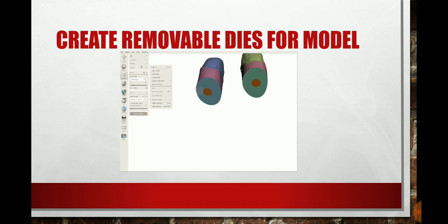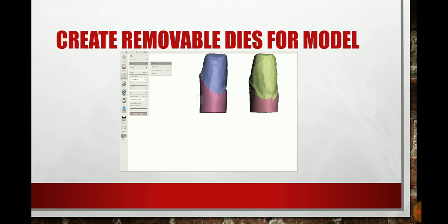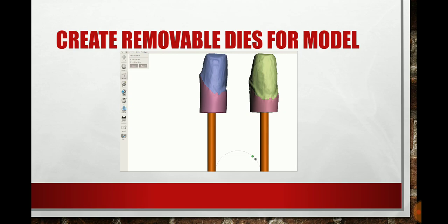Okay, so you've got both of them. So I selected both. So instead of one, you can do both of them at the same time. It's a little easier. And then, so that way when you put it back into the model, you can see how long they need to be, how short they need to be, what have you. So from here, if you optimize and you smooth the boundaries on those, that'll help you to have a nice clear circle going around. And now you just pull them straight down.